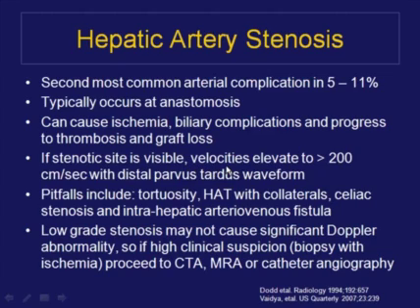The problem is that the hepatic artery often innately, or particularly when a transplant has been performed, is rather redundant and tortuous. This makes it difficult to actually find stenoses. In addition, there are often calculated high velocities, and this is just due to the vessel curling around. So we often rely, in this case, more on the downstream parvus tardus waveform when A, the vessel is very tortuous, or B, we can't even visualize the entire hepatic artery.